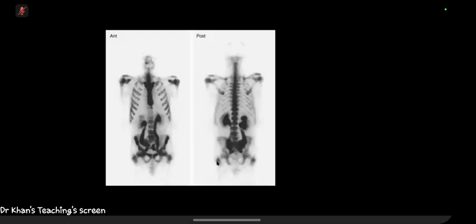again, if there's a primary history, the skeletal uptake could be different to what I'm seeing on the renal uptake. There could be two different diagnoses going on at that point as well.